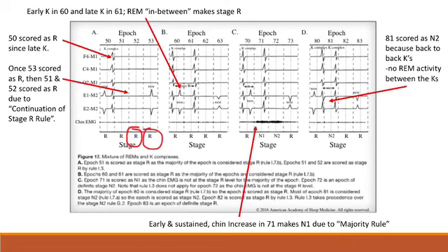So we have this period of activity here where you have a rapid eye movement right here, and then you have a rapid eye movement right here, but you only have the K complex happen in the second half of that epoch, and then nothing else occurred in 51 or 52 to say I'm stage 2, I'm stage 1, I'm stage 3. And so once REM represented itself in 53, then we go back and basically sandwich them together, and we can call it all stage REM.